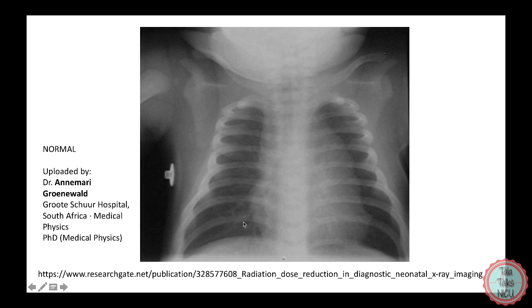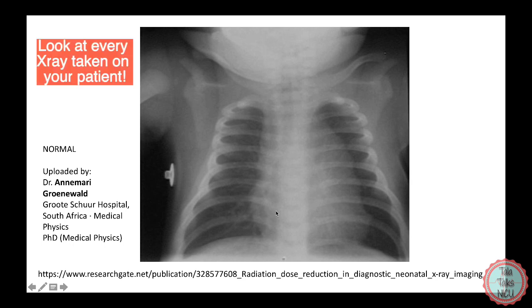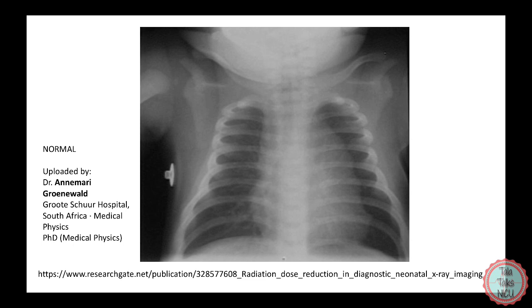Right, so let's get into actually looking at x-rays. And today we're just going to be looking at normal ones so that you have a really good fundamental basis for everything. So there are a few concepts I want to go over before we get down to reading the x-rays themselves. The first is that, like everything in medicine, the more you do something, the better you'll get at it. So get used to looking at every single x-ray your patient has. Often the x-ray pictures show up immediately on the machine, so look immediately. You know how busy units get, so never assume someone will see the x-ray immediately.